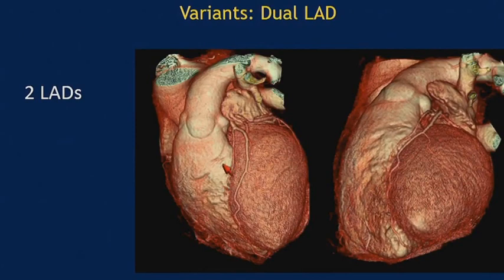And again, let's get reoriented to this image. This is our right ventricle, giving rise to the pulmonary artery. Here is our left ventricle. So this is the anterior interventricular groove, where lies this structure, which is our LAD, as we talked about by definition. But what you notice is that this LAD terminates relatively quickly, doesn't really go for the whole length.